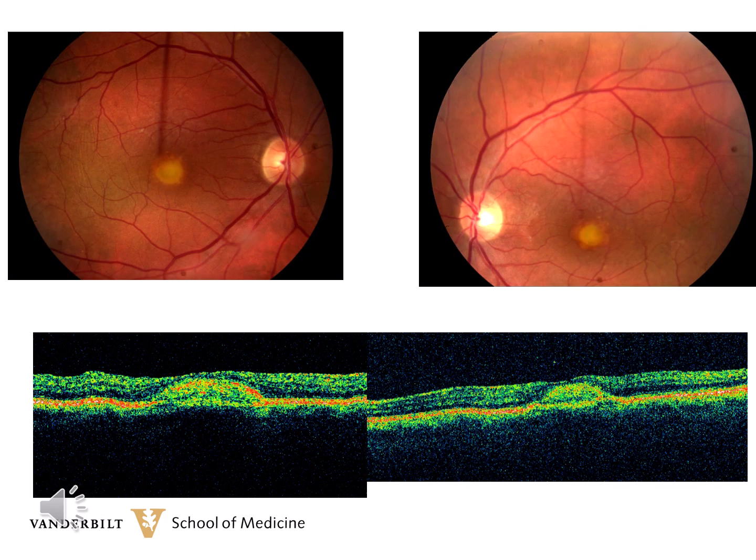Here's our very first example of a very well-developed vitelliform lesion in both eyes. This is a 72-year-old gentleman with 20/60 vision in both eyes, and he'd had some mild trouble reading over several years. This is an older Stratus OCT, and you can see, especially on the left eye, the pre-RPE sub-photoreceptor hyperreflective area. And you can also see the same on the right eye, although it's a little bit more difficult to pick out the RPE layer on this OCT.